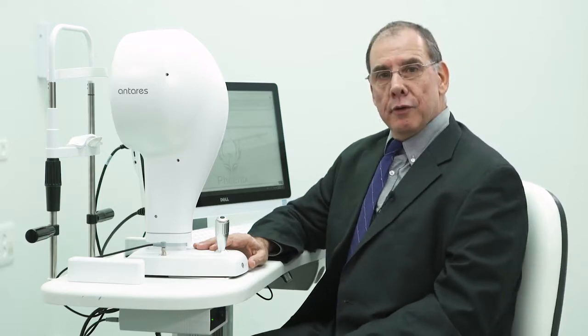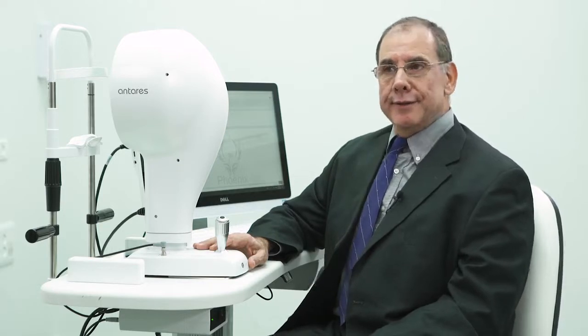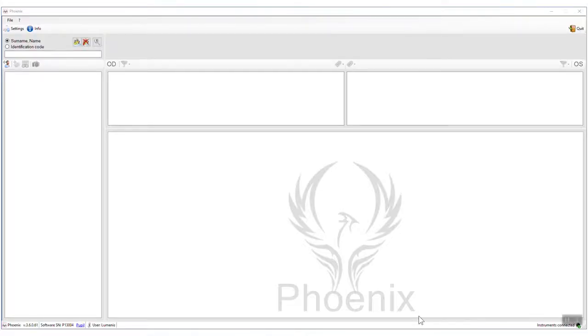Welcome to the Lumenis Antares Diagnostic System Training Program. Today we are going to look at the Antares system, which comprises a topographer together with a Meibomian imaging system, as well as a tear analysis system. We'll go through the whole system together and you'll learn what we can do with the system.